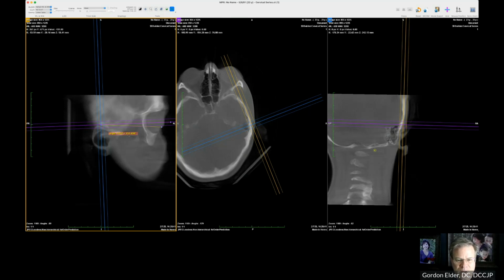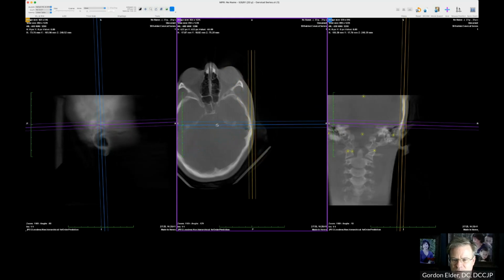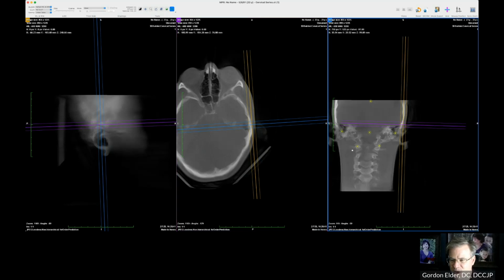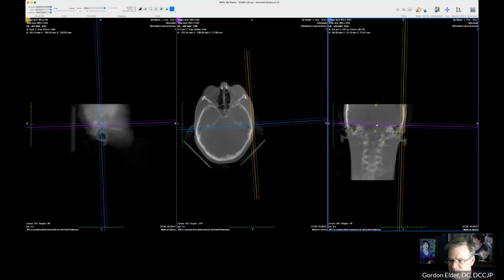And it's decreased. So I'm actually going to add, when I have my slope and I'm walking up to the patient and I'm using my slope or my convexity, I'm actually going to add 4.3 degrees to my angle, just to be that much more precise. Do we absolutely need to? No, this works great the way it does, but if we can be a little bit more precise, why not?